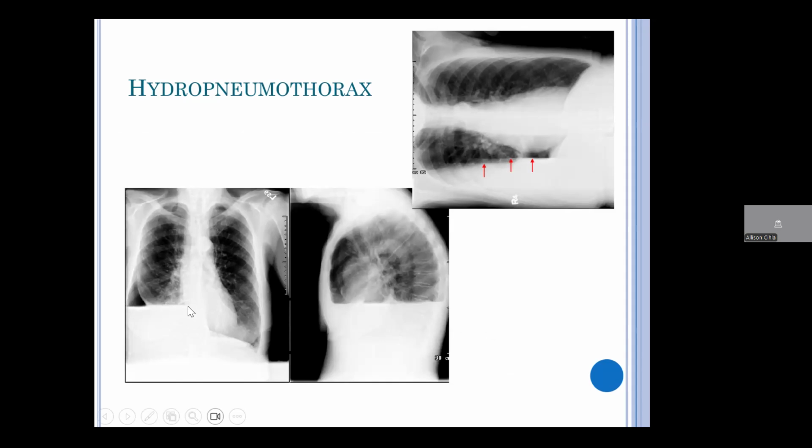There's a clear line within the pleural cavity of where this fluid lies. Above it is air, and then you can see lung over here. When you turn this patient sideways, you can see a clear line of fluid here. And when you lay this patient on their side, again, this layers out, and you can see this fluid here below the lungs.